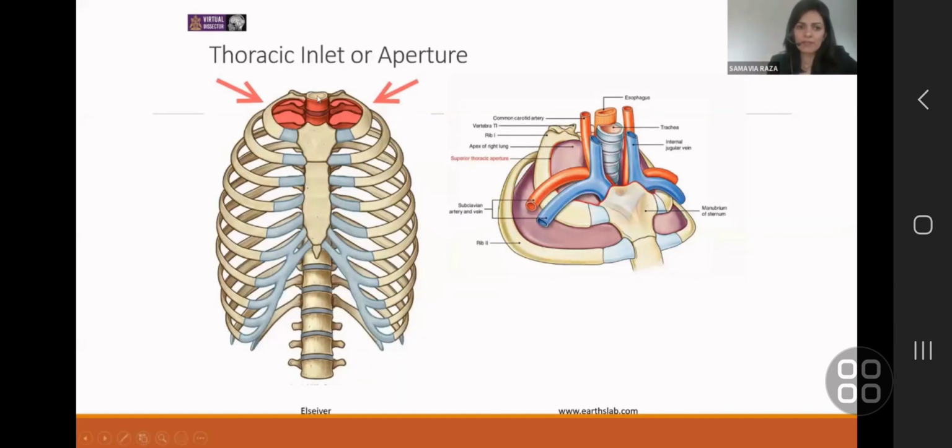When there is an opacity that you see in that part of the lung on frontal projection, the thing to consider is what is the normal anatomy of that region, and it's artery, vein, a bit of fat, and a bit of lung. That's all it is. So can you look into the previous records, previous imaging, and see something that happened there that could explain it?